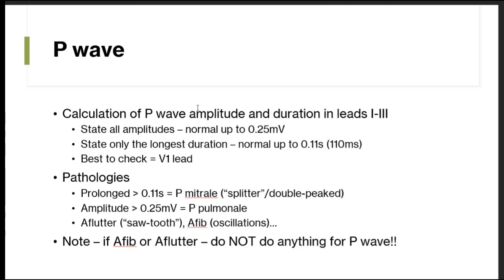It's either or. And for atrial flutter, you know that there is a particular rate at which the F waves, capital F waves, occur. There's a characteristic morphology of sawtooth appearance. For atrial fibrillation, there's no such characteristic appearance, and the only way to really get a diagnosis is through experience and while calculating the frequency in between these oscillations.